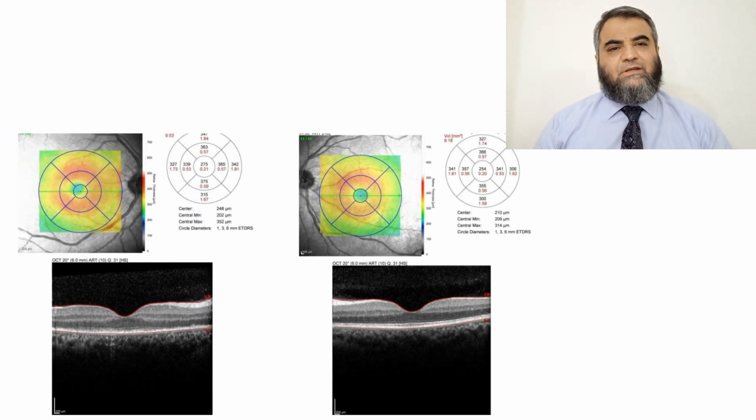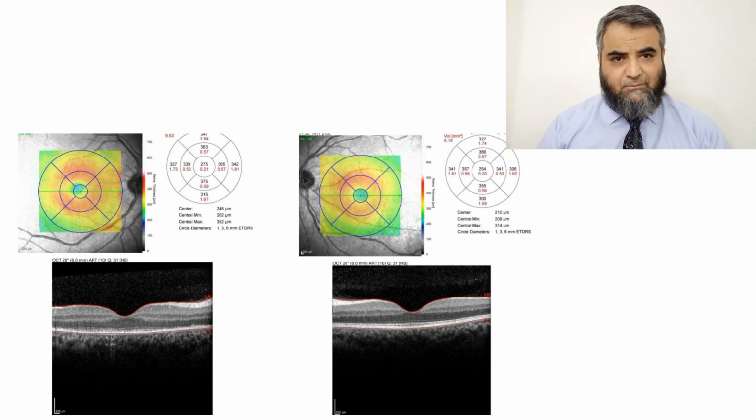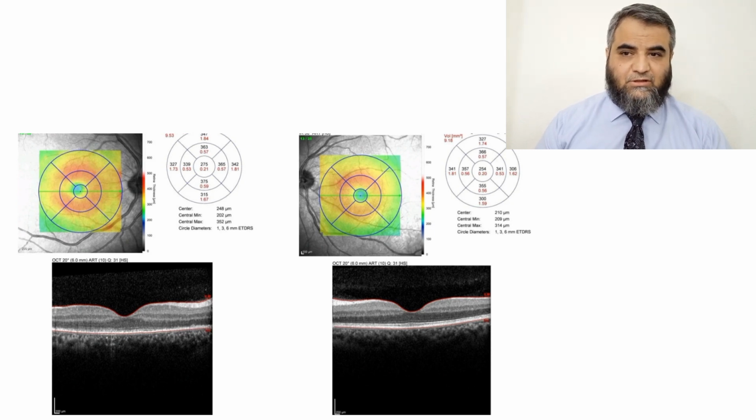Talking about OCT, it also has a very beneficial role in treatment. It shows us macular edema, and the involvement of different layers, choriocapillaris, RPE, and so on. But in this particular patient, there was no macular edema. Usually macular edema is present in these patients, and they can develop choroidal neovascularization. Once macular edema appears, it is an indication that treatment should be started. But surprisingly, in this patient's images, you will not find any macular edema.